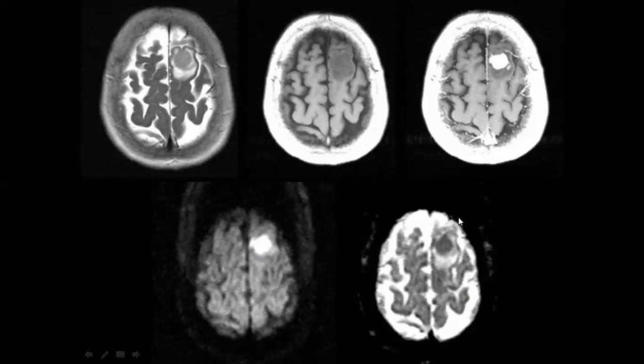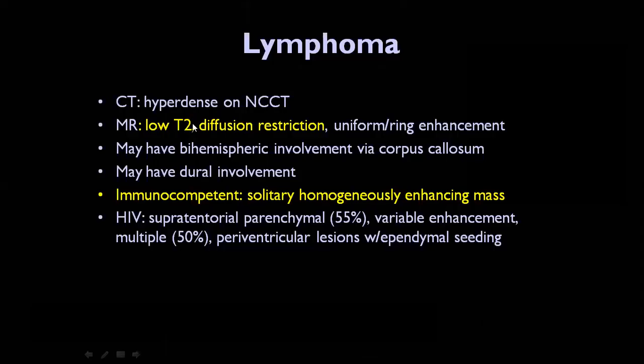So this patient has true restriction, and when you have true restriction, you think about either lymphoma or high-grade glioma or metastasis, which can cause restriction. But in this case, low T2 signal goes more with lymphoma, especially if this patient is immunocompromised or has a history of immunocompression. They like it in the exam, yes, they like it very much. So you will find it, inshallah. I hope that you do not find it, but you'll find it, yes.